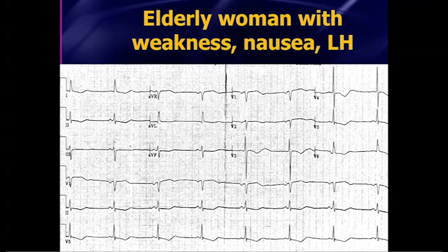So we'll briefly run through the basics here. The overall rate looks okay. I'm not going to count it out, but it's probably the 50s to 60s or so. We'll say her blood pressure is okay, so we're not going to turn this into an unstable bradycardia type of case. This is sinus, and just for the heck of it, we'll talk about that for a second. Sinus is defined as upright P waves in 1, 2, 3, aVF and inverted P waves in aVR. That's how you know this atrial impulse is coming from the sinus node.